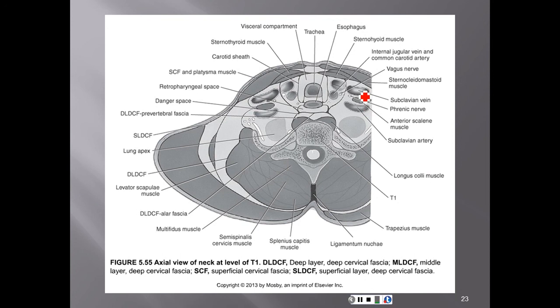So remember when the physicians or whoever is putting in the central line, they're going in the subclavian vein, and that's because it is more superficial. They have the lungs, and it's the lungs right there. And this here's a good picture of the platysma muscle, which fans out into the anterior chest.